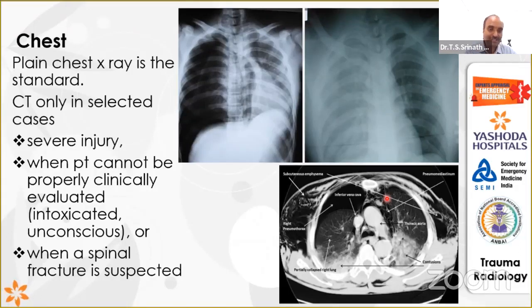For every X-ray you take, you have to know the first details of the patient, whether you have taken the right patient and you're mentioning it. Then name, date of birth, though sometimes date of birth may not be there. Film type, AP view or PA view, because the modality will change. Then R is for rotation, whether it is an inspiratory film or overexposure, all these things you have to look for.